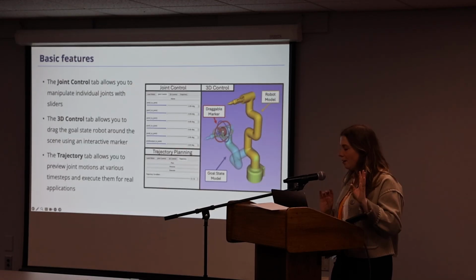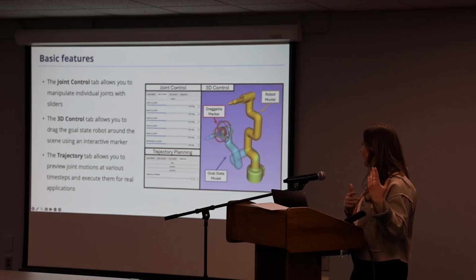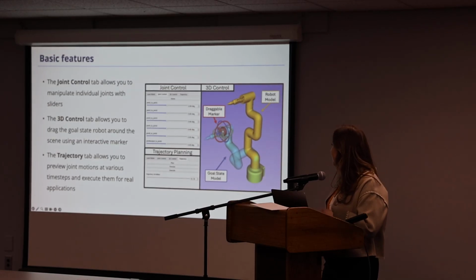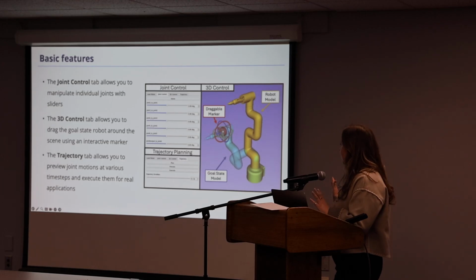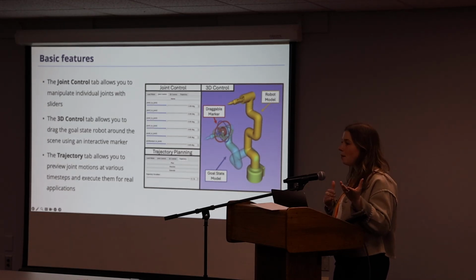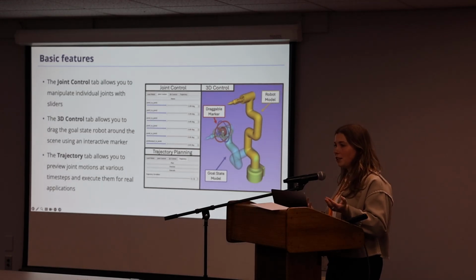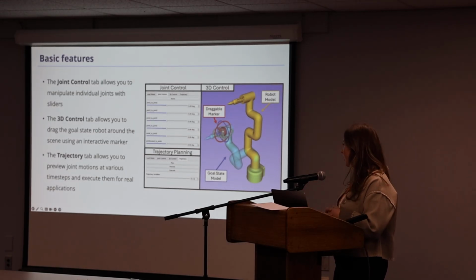I'll start with just going over roughly the basic features that you'll play with today, and then we'll see how far we can get in the last bit of the workshop. But it's a pretty simple module. We have like 3 tabs that we use. We just ported the basic features of MoveIt into here. And then the idea is we can add collision planning on top of that, or depending on your application, you can customize it.